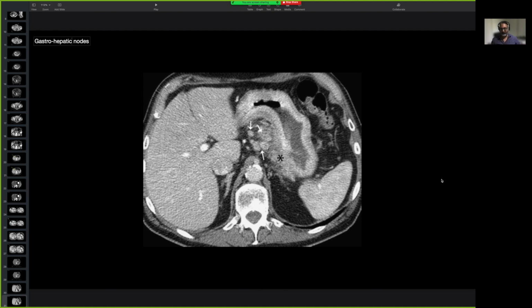These are gastrohepatic nodes. Oh, no. This is a gastrosplenic node. I forgot. Yeah, that's the gastrosplenic node. Now I remember. That one there, because it goes along with the splenic vein. The pancreas is here also. That could be considered a gastrosplenic node. But these would be, the pancreas is right here. This is where the pancreas should be. That's the stomach. This is the stomach. That's the spleen. And so the lymph nodes here can be considered gastrosplenic, and the ones here definitely gastrosplenic. These are gastrohepatic.